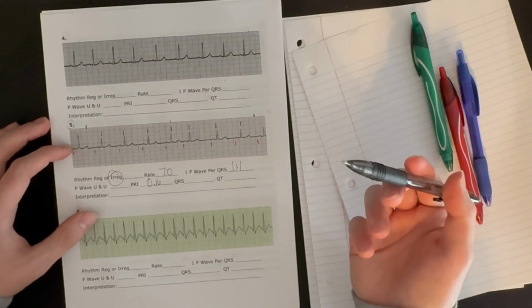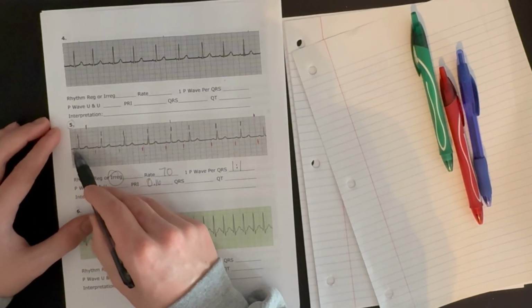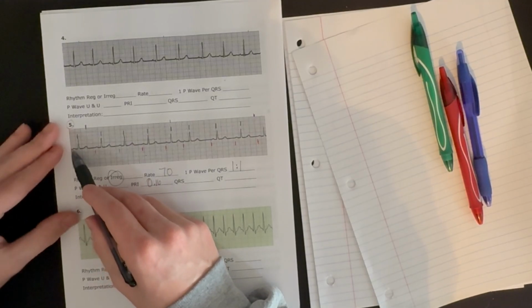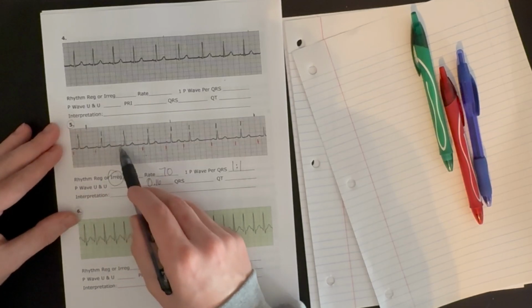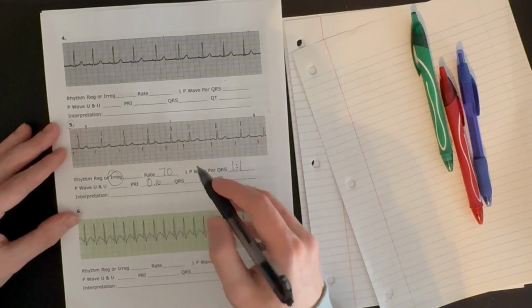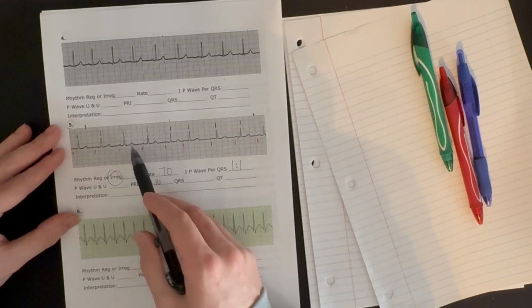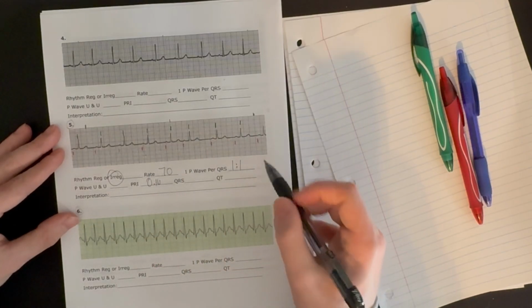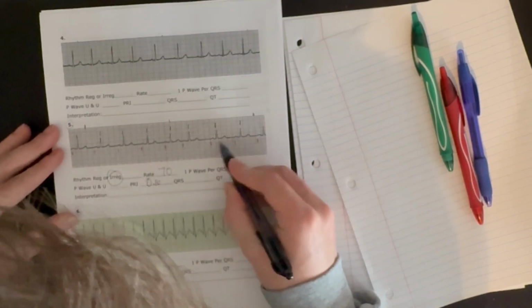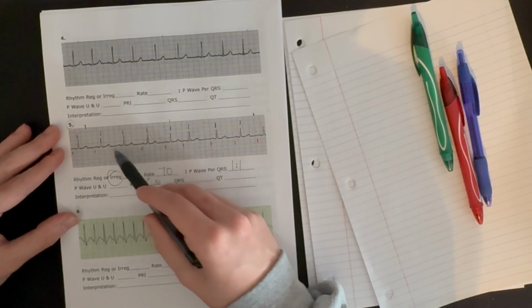Let's check our QRS complexes and look at our P waves. It's a little short, but that's fine. It's still an upward deflecting semicircle for every single one. Now let's check our QRS complex. Last thing. How do they look? They look narrow. And if we count, it's about 2 boxes on each one. So about 0.08 seconds, and it's consistently that way.